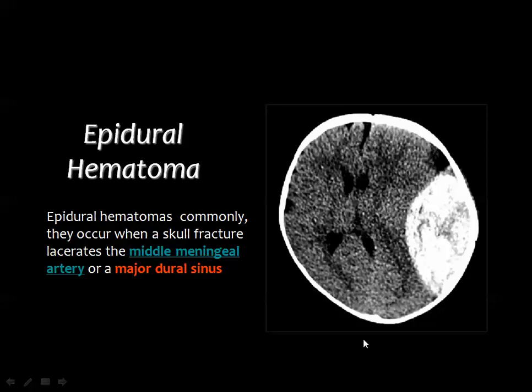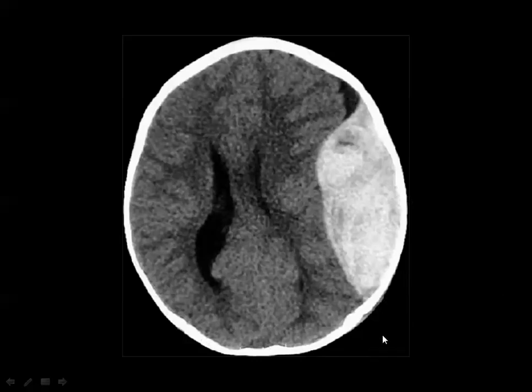This is a big epidural hematoma on the left side, having a typical appearance, hyperdensity related to the inner table of the calvarium with convex inner margin, and you see the significant mass effect on the ventricles. And this is also a good example of epidural hematoma on the left side with convex inner margin and compression of the left lateral ventricle with dilatation of the right lateral ventricle secondary to kink of its foramen of Monroe.